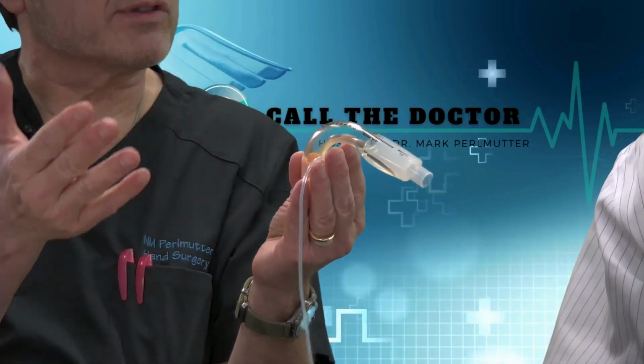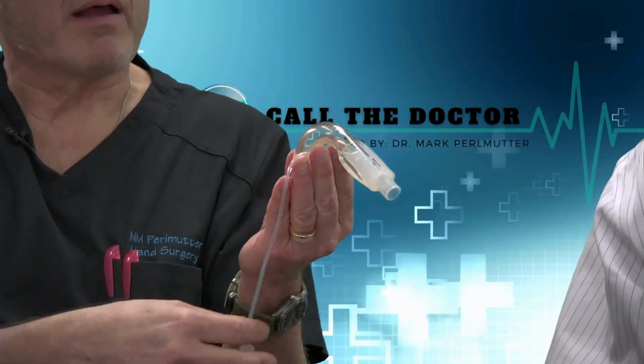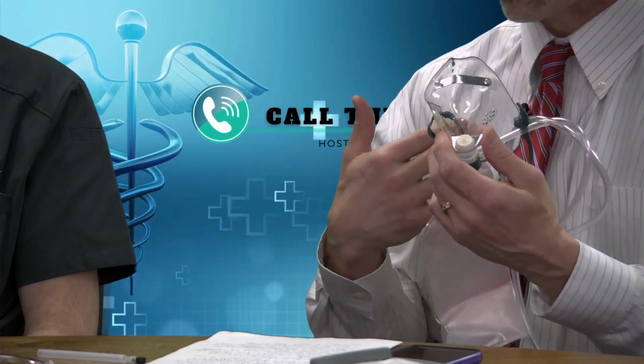So there's different levels of ways of getting oxygen into somebody, but if possible, the preferred way is actually to have them breathing on their own, but not feeling any pain, and that's the block that we're talking about. Yes, and these two pieces of equipment are what we use when we're doing anesthesia with block or the nerve block, where we don't have to put people under general anesthesia and they're allowed to breathe on their own naturally. This is just a mask that would fit over the nose and mouth, and the patient breathes on their own without any assistance from any machines.